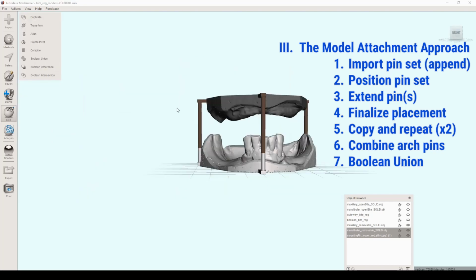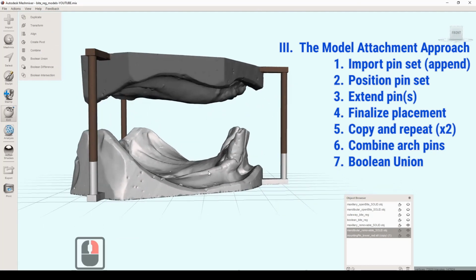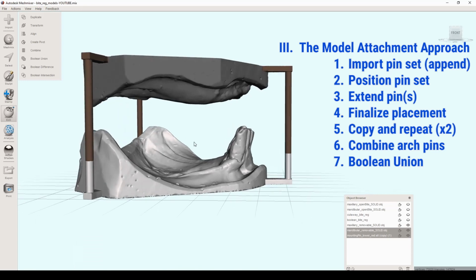Okay, so I figured it out, and I debated whether or not I should just basically start this section of the video over again. But if I'm being honest, I think it's good to kind of see, what would you do, if this does happen? Like, I think this happens to so many people, and they get discouraged, and they're like, I can't repeat what happened on the video, etc.